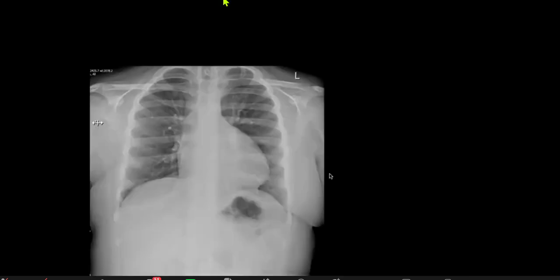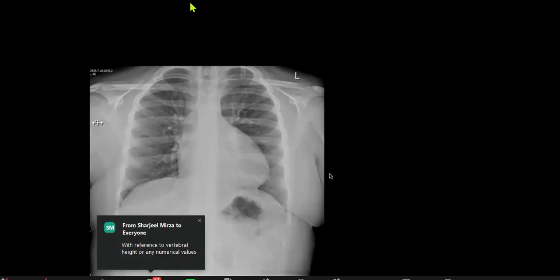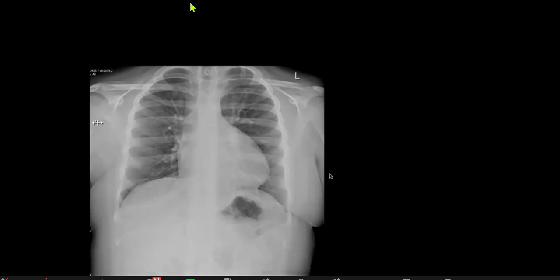Going through it systematically, this looks like a chest radiograph of a slightly older child, levocardia with gastric bubble on the left, in keeping with situs solitus. The aorta, I think, is a right-sided aortic arch. Pulmonary arteries are normal.